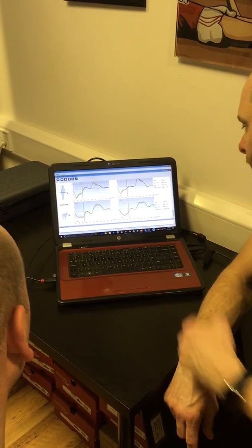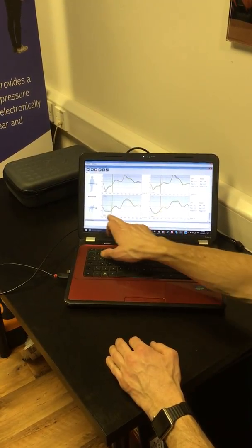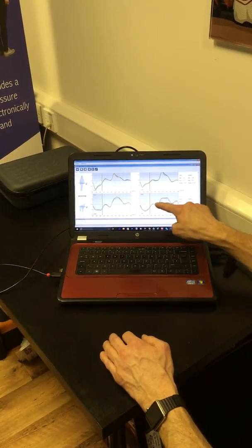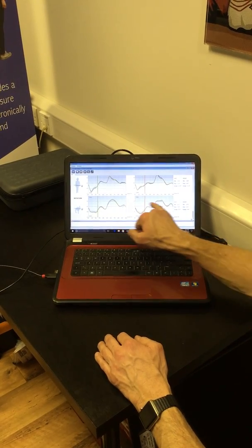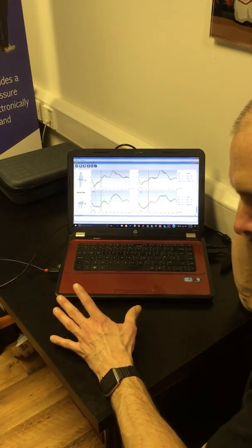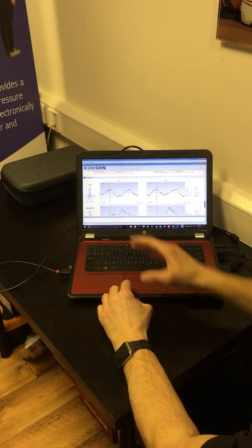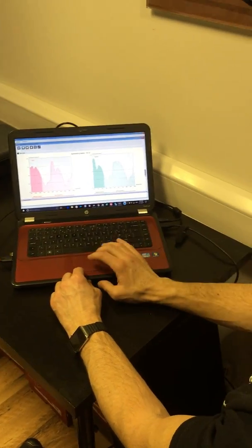We can see the numbers are different from minimums and maximums. And then we look at the graph and we can see exactly where. We're dipping quite a lot lower here in the stance phase, a lot longer compared to this. A bigger dip there, and then we've got quite a wavy, big spread here rather than the slightly good curve. And then really the end, although this doesn't reach as high, the overall impression is that the picture looks fairly similar, but we've got some changes to our minimums and maximums. So we know that rotation and your tilt left to right have probably got more work to be done on than your tilt front to back. This is probably much more concerning, what's going on with your pelvis around there.